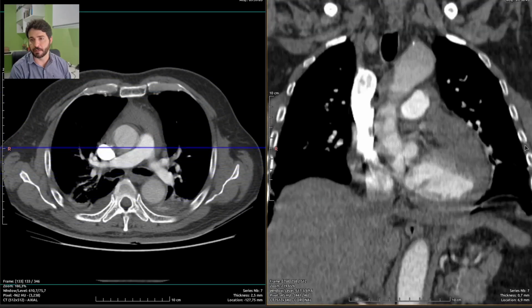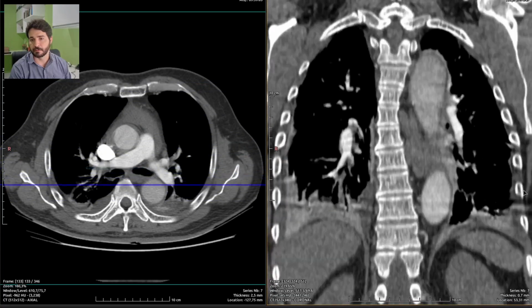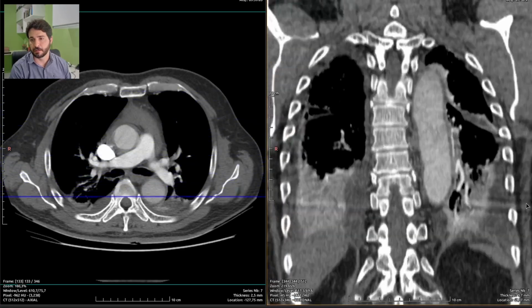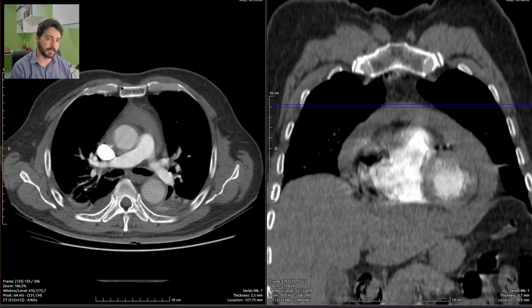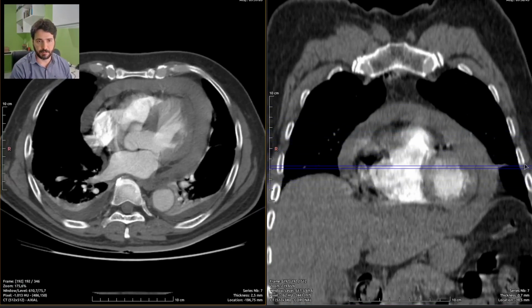I have, and I'm going to report it. Just settle down. We are looking for vascular diseases, not pericardial effusions. Come on, focus. So there is no arterial thrombosis of the pulmonary circulation.